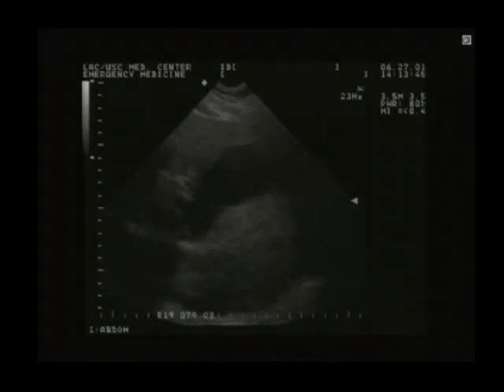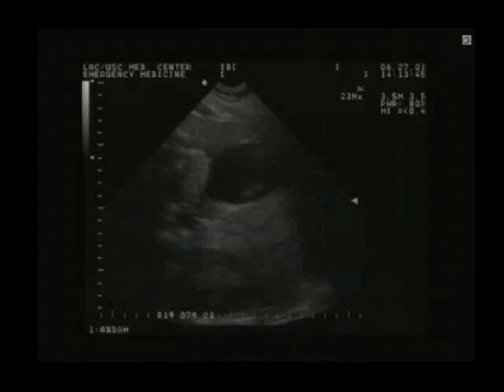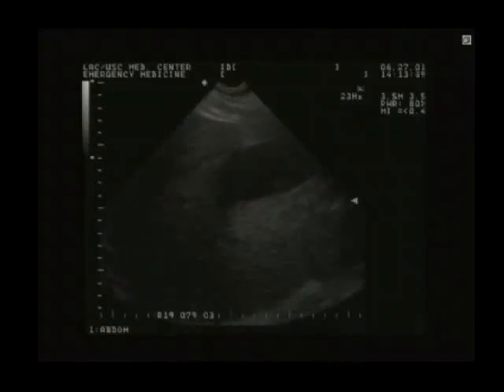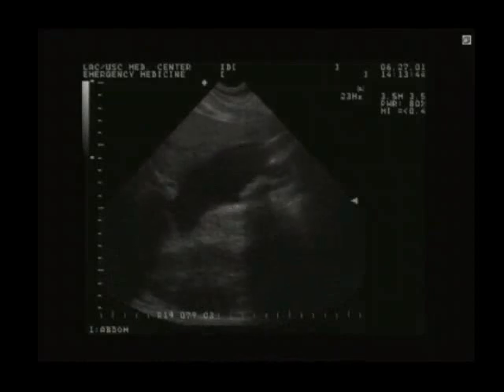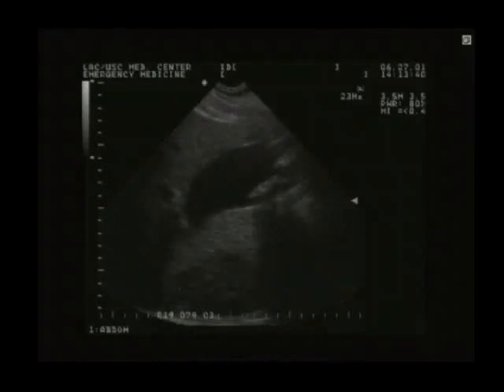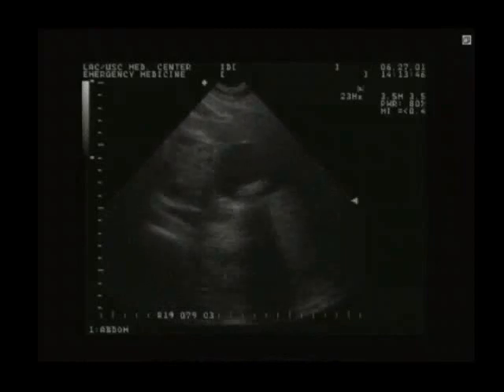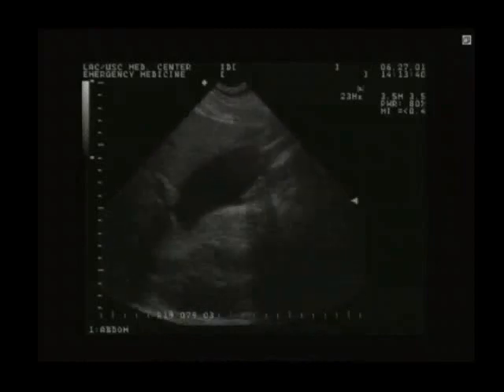What's the relation to the last meal? Basically, if they've just eaten, obviously a fatty food especially, the gallbladder is usually contracted, and the gallbladder will be difficult to visualize. Now, with that said, most of our patients with true abdominal pain are NPO, not eaten for at least a few hours, and you can scan them. But obviously for outpatient scanning, a radiologist would want them NPO.